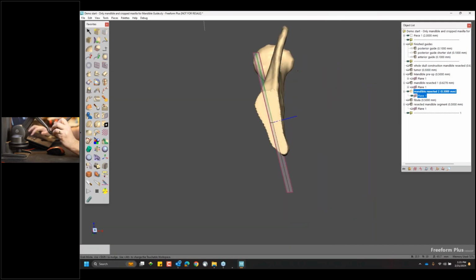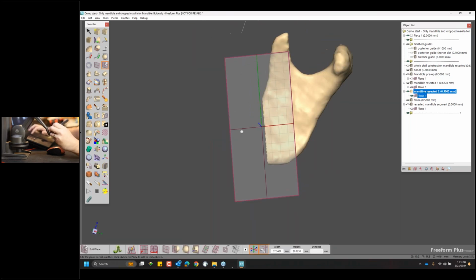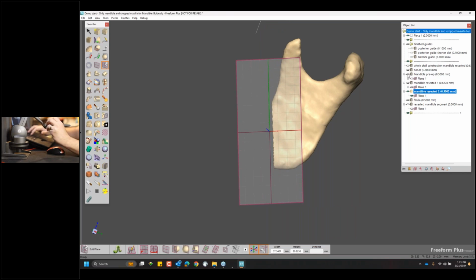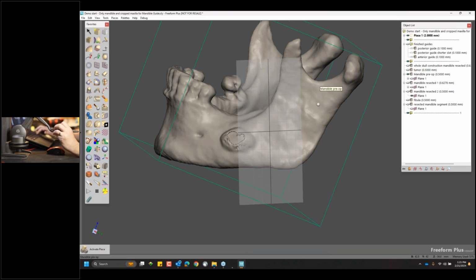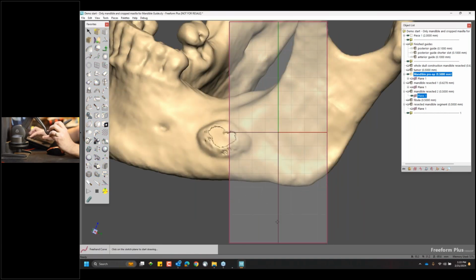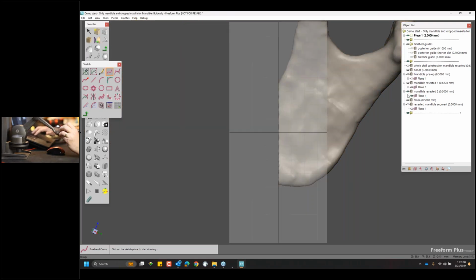Look down along the surface of the bone and pull this off the surface because I'm going to create sketches in order to define the region of the guide. Turn back on the pre-op mandible and hide the resection really quickly. So the first thing we need to do is create, actually I will go back to the resected view because we want to see the bone.